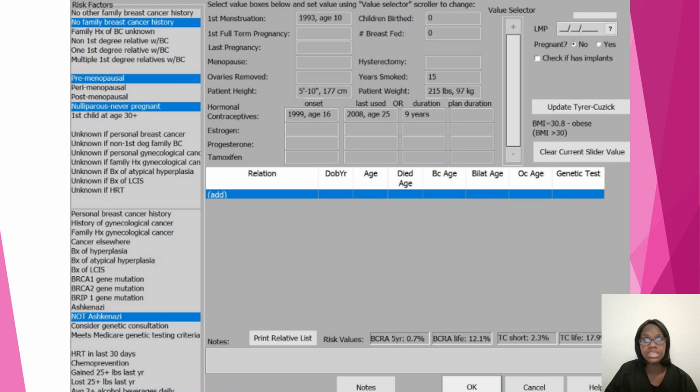So you'll have your patient. Normally, if you work at a place where the iPad is connected to this system, it gets connected to our PenRad charting system and it's already filled out.